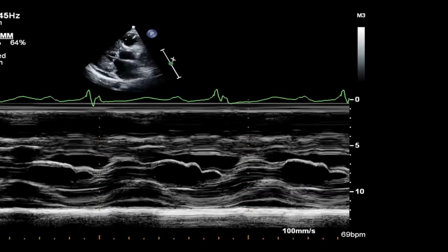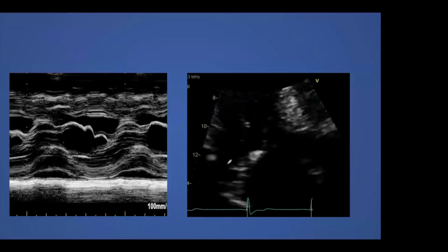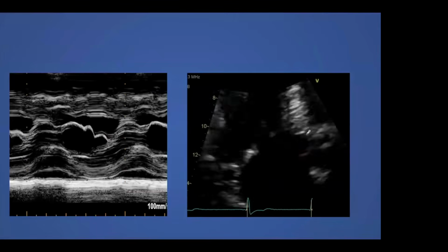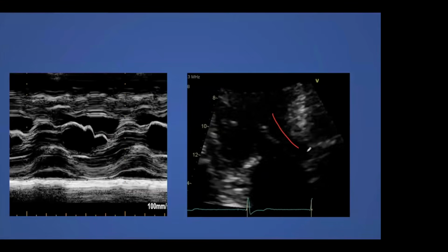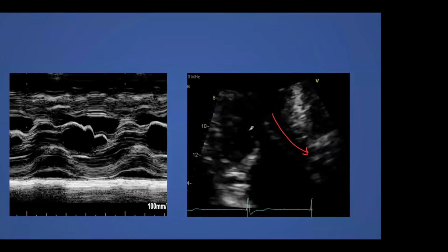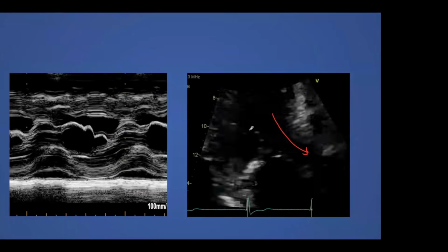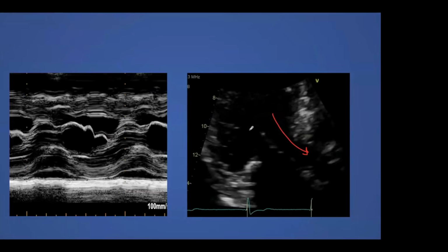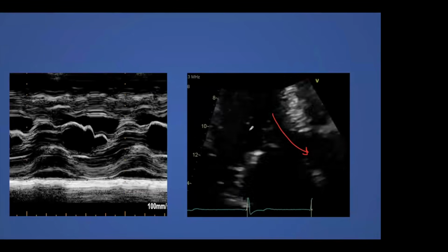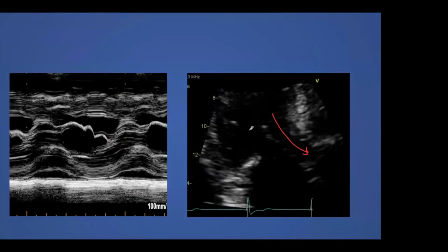So we can see now, you can see the LVH here, and you know that during systole, he will have SAM. So what will happen? It's like what they call the Venturi effect, with the high velocity going through the LVOT. It will pull the anterior mitral valve leaflet, and there are degrees, like the length of the SAM during the cycle. Is there a contact with the septum or not? This is how you diagnose your patient, how severe it is.